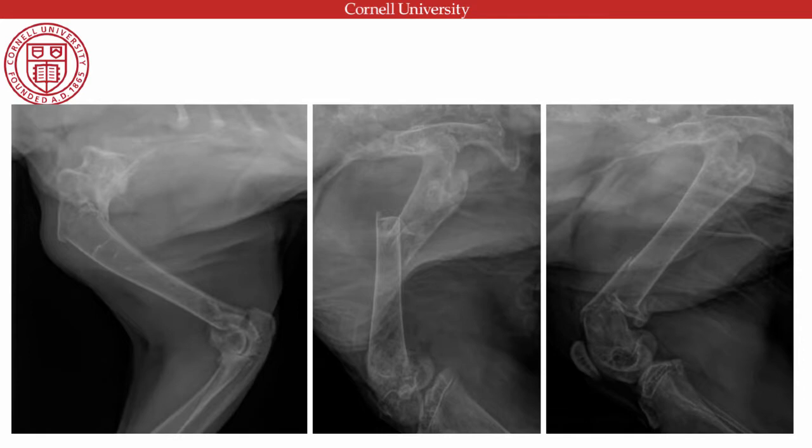And osteopenic? Yeah, I think so. Look at this cortex. Look how thin they are. They're kind of pencil thin. Really, really fine pencil line thin, aren't they? And these fractures are interesting because they look like they're almost collapsed. Like this bone looks, rather than snapped, it looks folded. And that's a classic folding fracture.